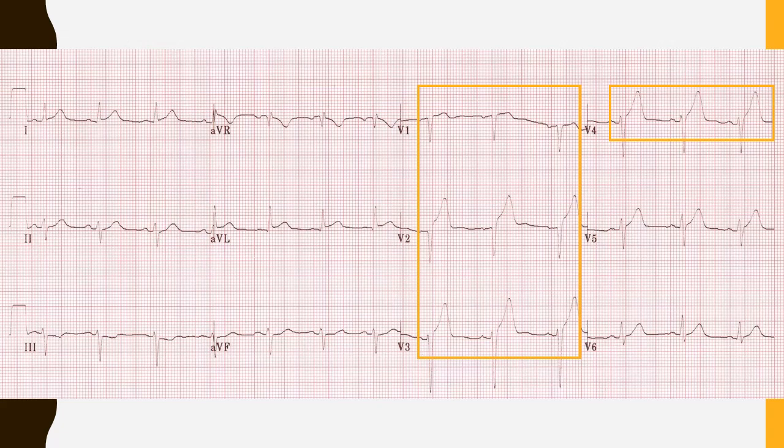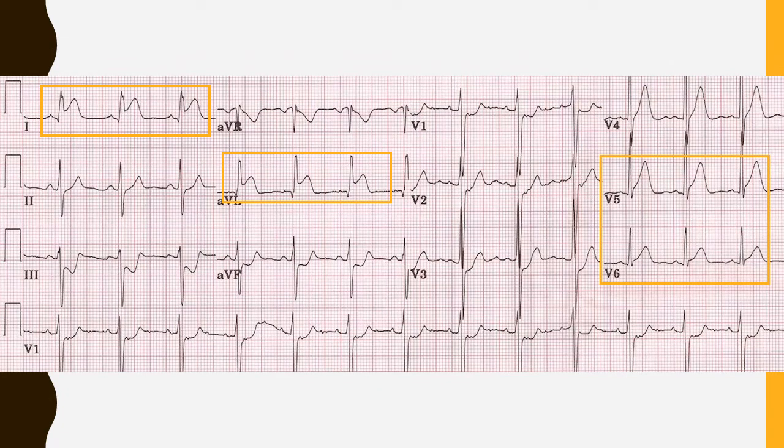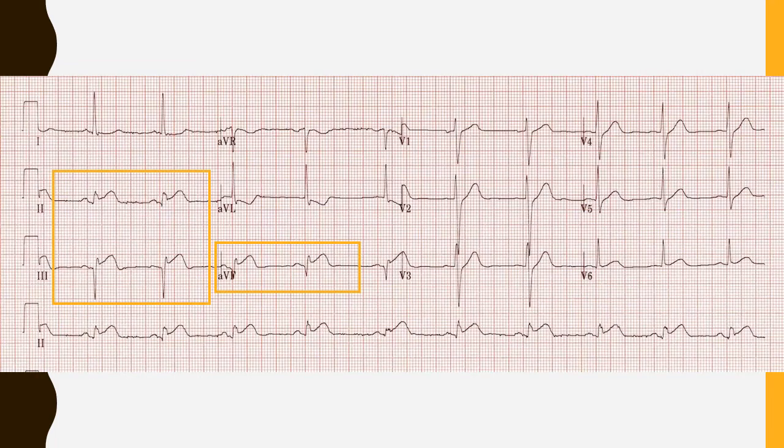This is likely an LAD/anterior STEMI. This is likely a circumflex or lateral STEMI. This is likely an RCA or inferior STEMI.